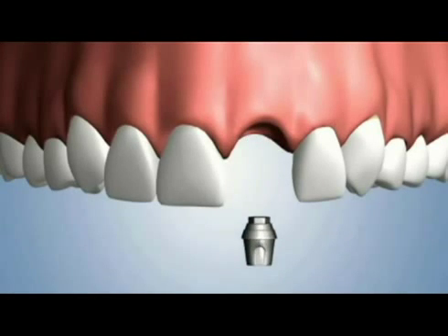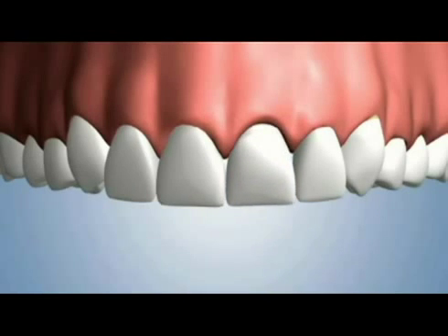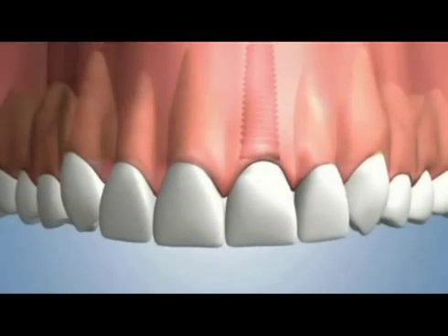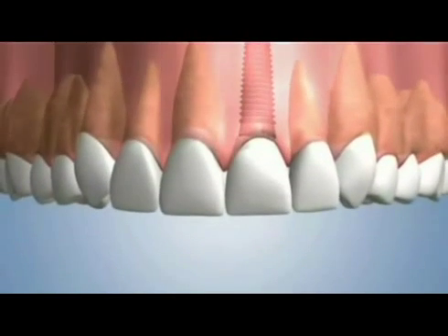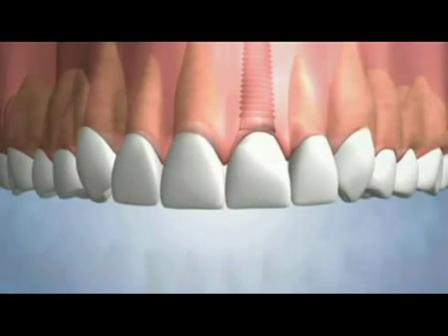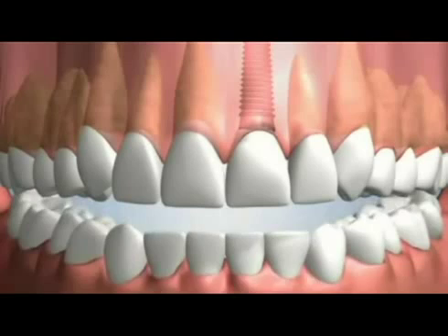The fourth option replaces the natural tooth root with a dental implant that is inserted into the bone. An abutment is secured to the implant, and a crown is secured to the abutment. The dental implant option closely mimics the design and function of your natural tooth. The dental implant is the most secure option, with a solid foundation of bone that keeps it stable, withstanding the forces of biting and chewing.